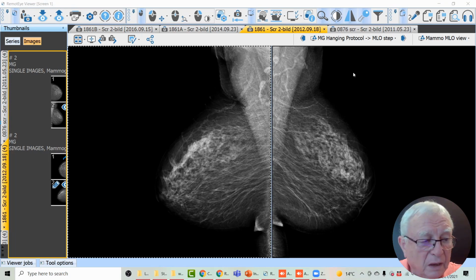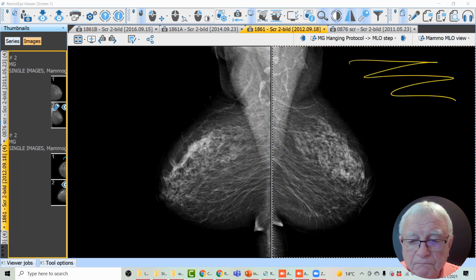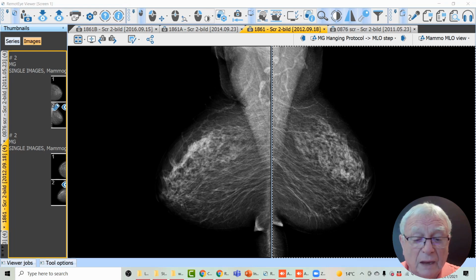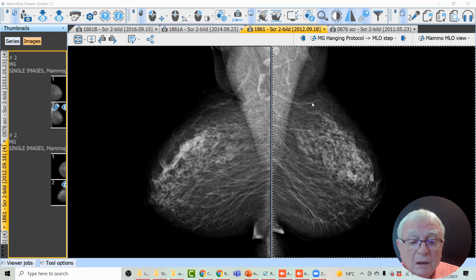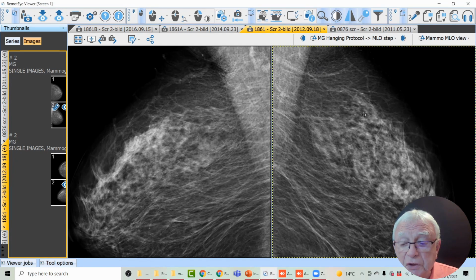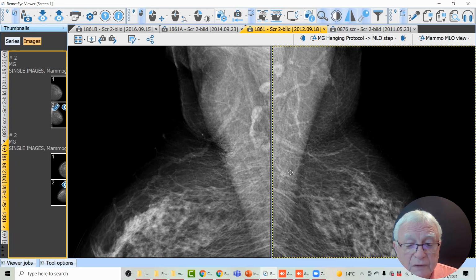You bought a fantastic tool and it's in front of you and you don't use this part. Tell me, why don't you use this? I think you should. I think we all should use it. And this is the way to do. Like this, until the skin touches the edge of the monitor. Side by side, 2 seconds, normal lymph nodes, thank you.